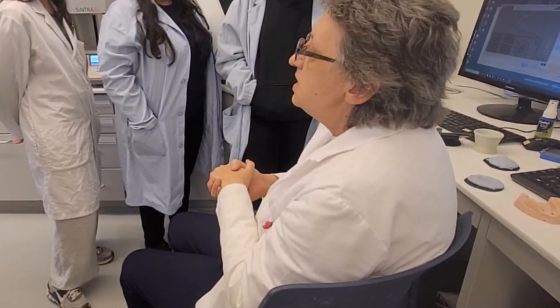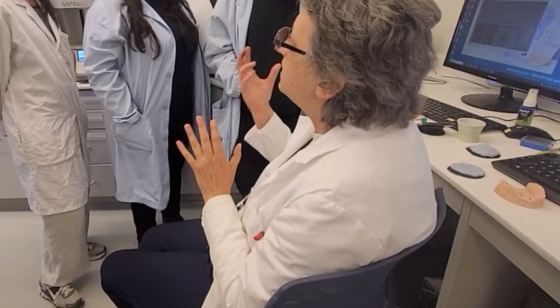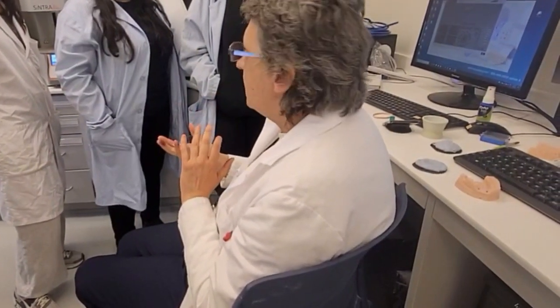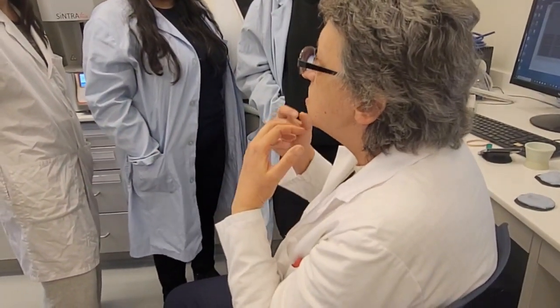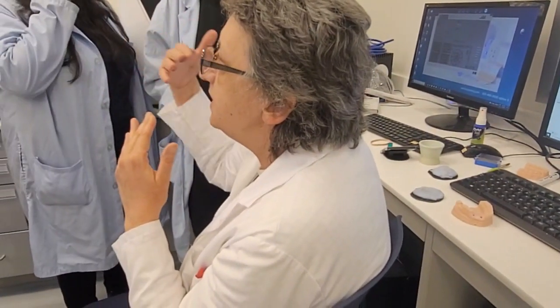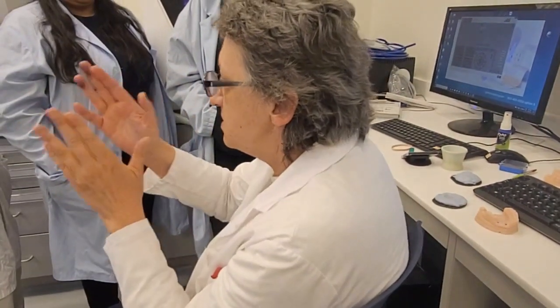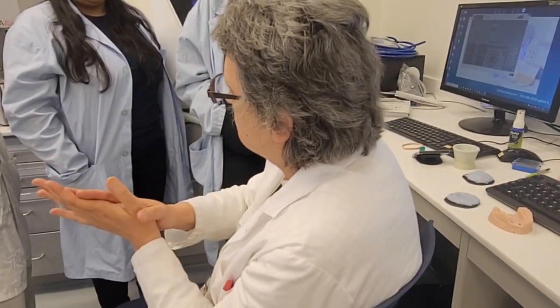So for dentures and for large dental areas where the tissue can be identified as a landmark, we use what's called a fiduciary marker, which has exactly the same purpose as a scan flag, but for tissue. So we put it on, let's say, the palate, and it's going to identify the area where we want to concentrate, especially in implant planning. So if you hear the name scan flag, now you know what it is. If you hear the name fiduciary marker, you know what it is, okay?